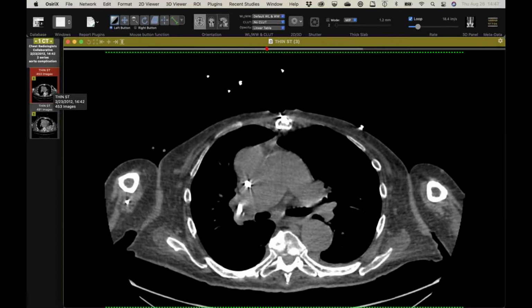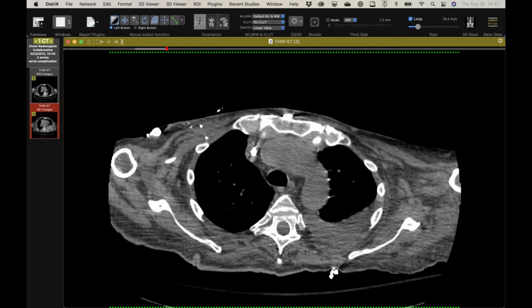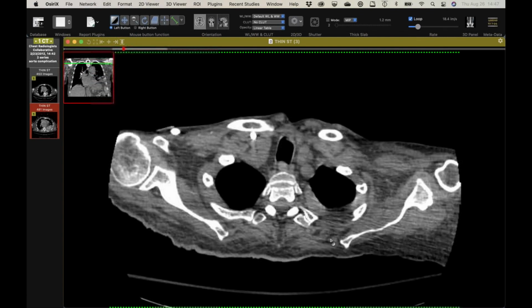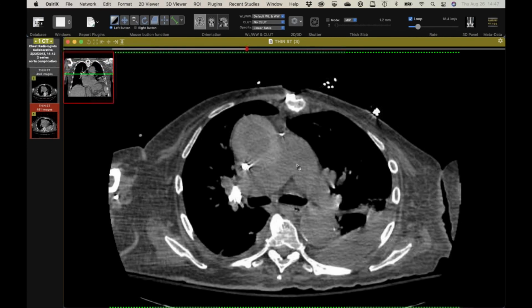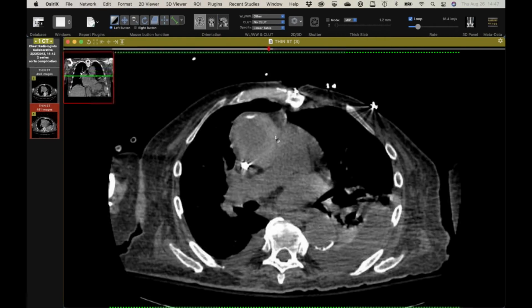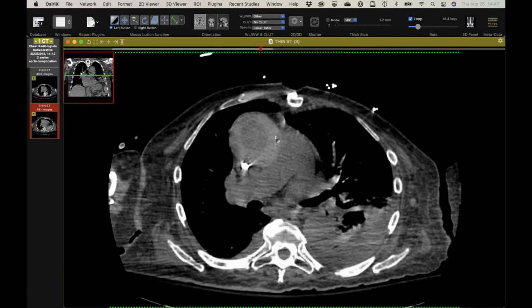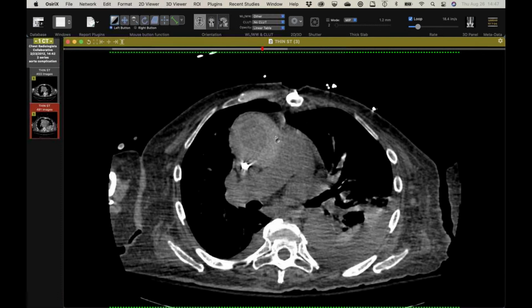So fast forward a month later, they scanned him only because they were concerned about this pleural effusion. He was walking around, eating, fairly hemodynamically stable. His trach is out at this point. And this is one of the ones you open up and all of a sudden you see something like this, kind of makes your heart skip a beat or two. I mean, clearly there's this new dense rim around the graft, and it's blood. I was not expecting to see that, and in such a stable patient. And so, here we are 8 weeks out of transplant.